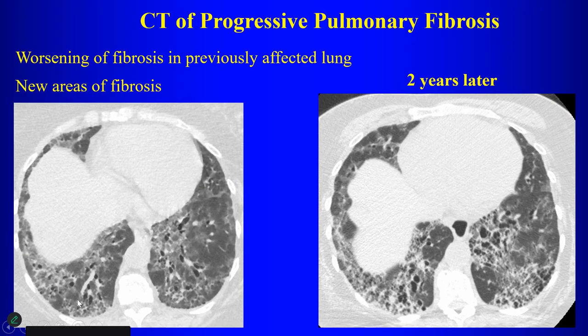So here's a patient with ground glass and traction bronchiectasis. Their follow-up CT shows the traction bronchiectasis is worse. It shows worsening disease here in the periphery, there in the left lower lobe. So this patient would say has progressive pulmonary fibrosis. So with these findings now, this patient would be a candidate for antifibrotic therapy. And this is becoming our role in terms of interpreting these cases. Okay?